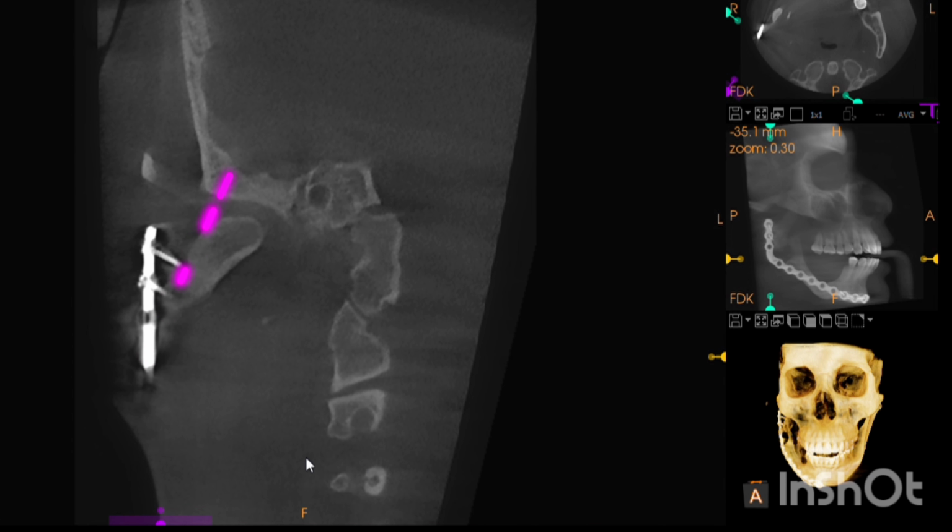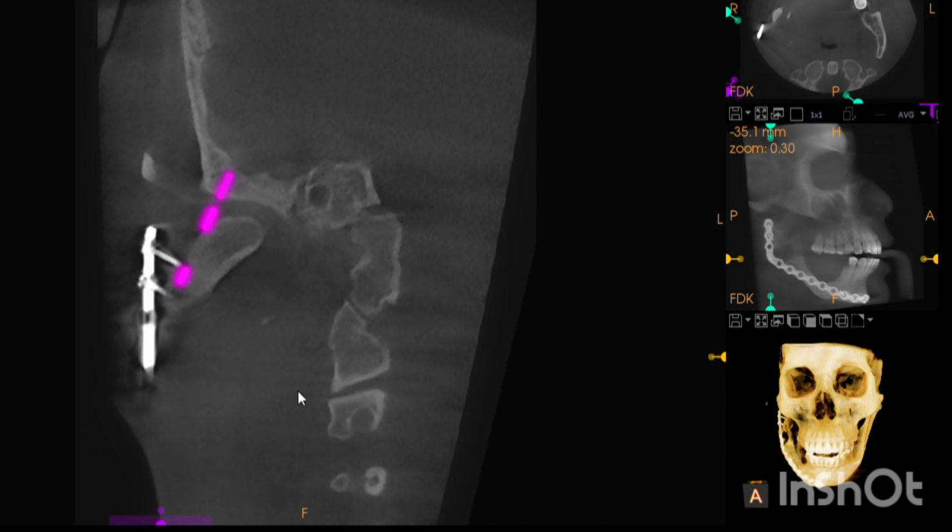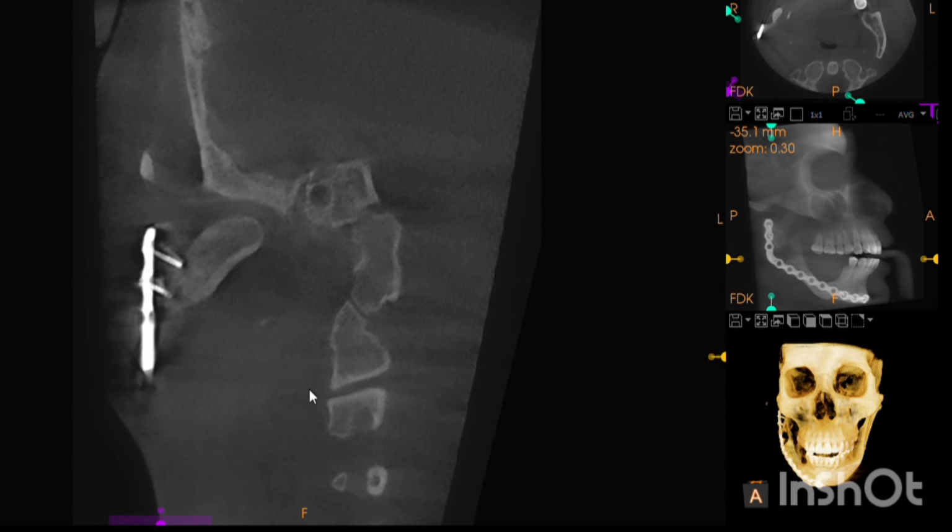See, you can see these are the screws of the plate. Ideally, whenever you attach any plate, it has to be attached completely with the bone where the plate is. But here, this fragment has moved, and this plate also, so they are no more completely in contact. I'll show you the remaining plate later, but here this is the case which has happened.